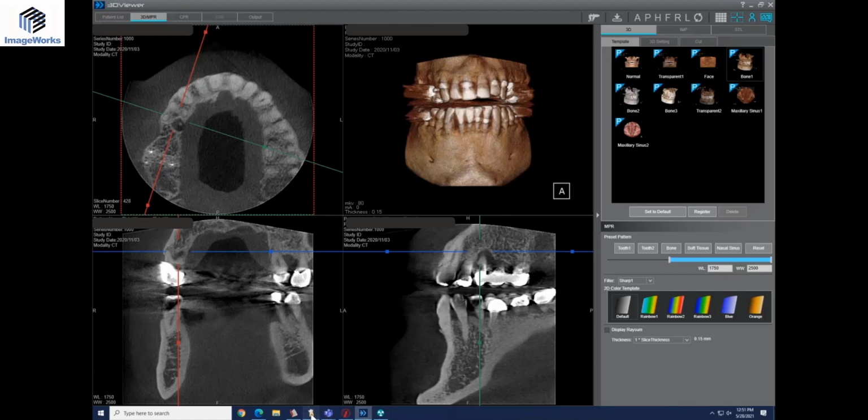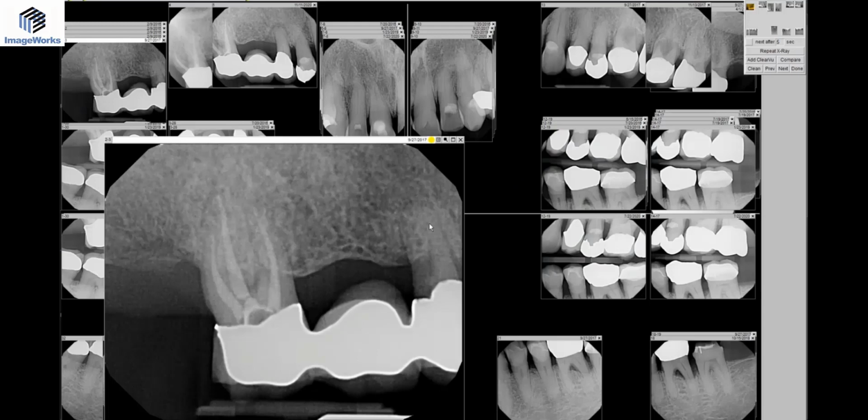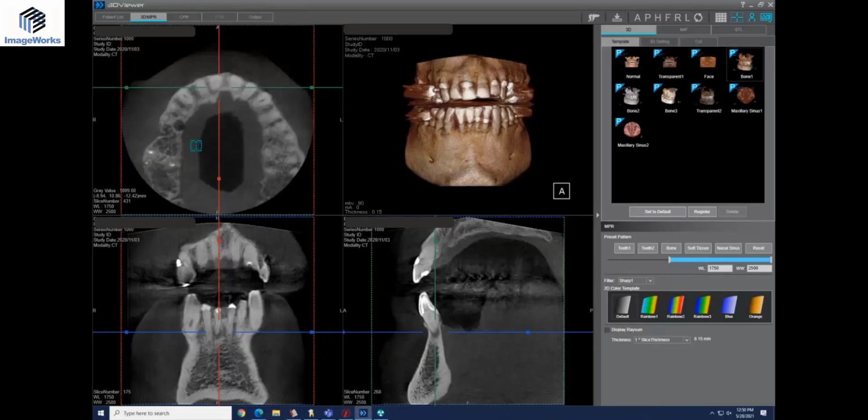Let's see if I have. See, this is how he presented with the regular radiographs. It really picks up probably the buccal root with the lingual root superimposed, and the bone looks fine, but it's all blown out on the other side. So if you only had the 2D, you would have no idea that was going on. And besides that, he was totally asymptomatic. He had no complaints, no mobility because it was all held by the molar here. He had the stability, but wow, that was such a shock to find that one.